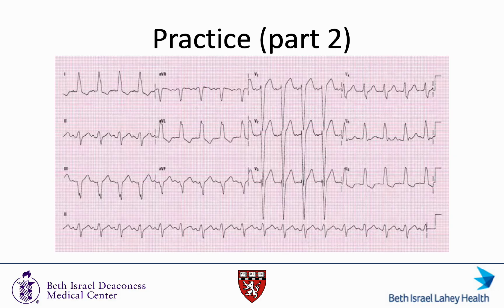Here's another practice EKG. Again, feel free to pause so that you can take a look at it yourself before we go through it.